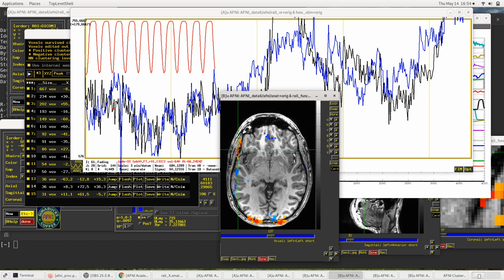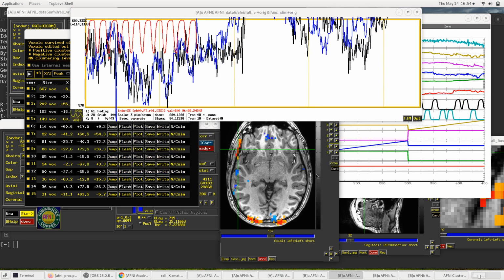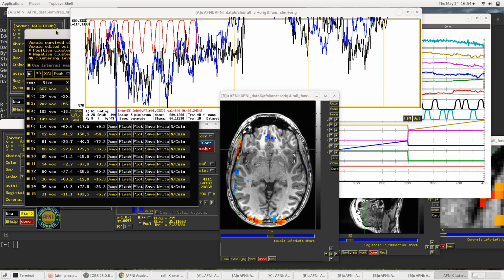So you might have to explain that in a paper. And if you haven't masked the data, you might not realize that it is just a muscular response. Okay, so let's move on to the next cluster then.